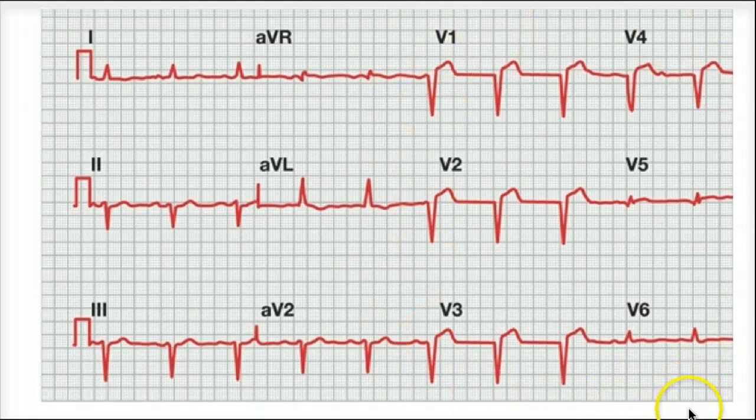This is a beautiful diagram. Now, even in limb leads, we can see Q wave, a little bit of ST segment elevation here, right? This is a diagrammatic picture. This is not a real EKG, so that's why things are so strikingly obvious. We can even see it here, Q wave, ST segment elevation a little bit. So it's easier to interpret these than real EKGs.